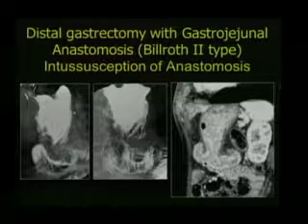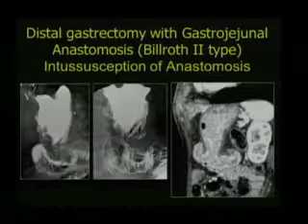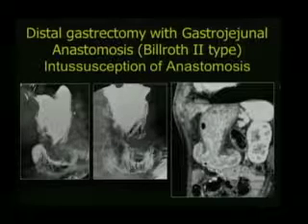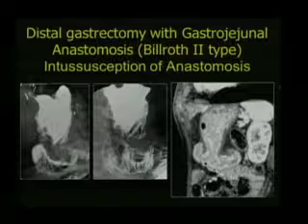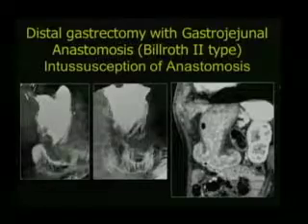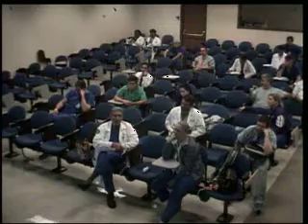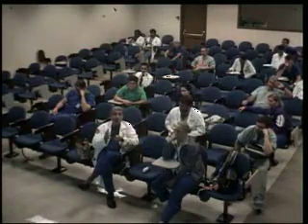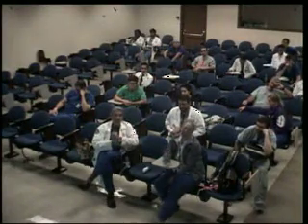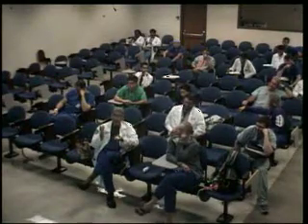How far from the surgery was it, Roberto? How far from the surgery? I don't remember. I don't recall. No, really, let me correct a little bit. It's a misdiagnosis. You know the abnormality, but you interpreted it as not what it really was. So we performed the CT, with coronal and axial reconstructions. You know there's a problem. Oh, yeah, okay, thank you. You misinterpreted. Yeah. It needs a scope.